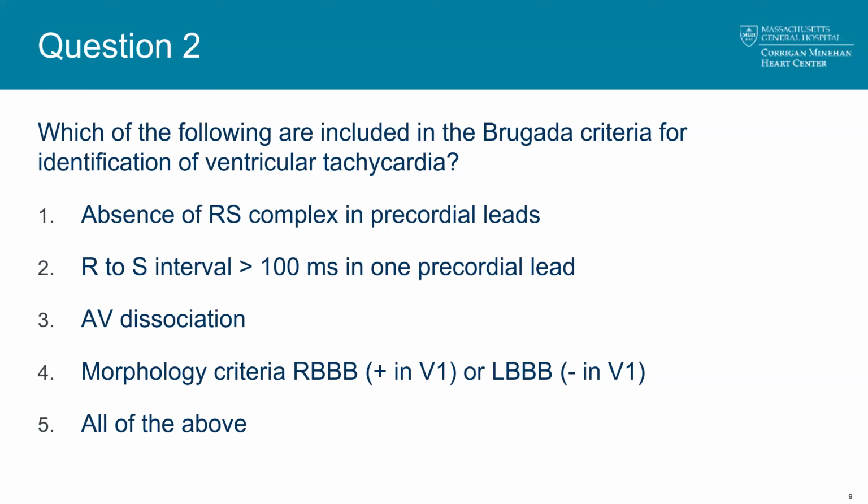So all these possible explanations are in play, meaning this could be supraventricular tachycardia with these atrial notches, possibly atrial notches. Nobody knows what to make of them. They're irregular. They could even be artifact, or is it ventricular tachycardia?